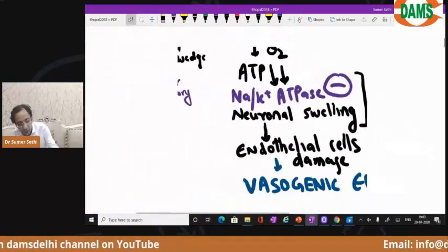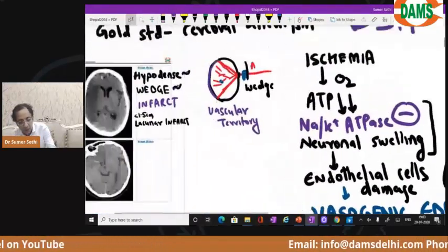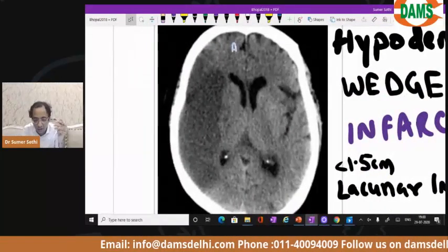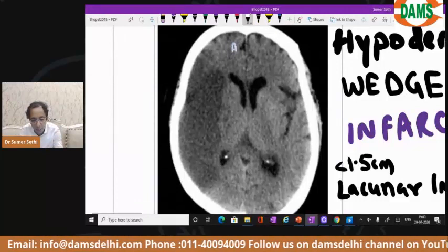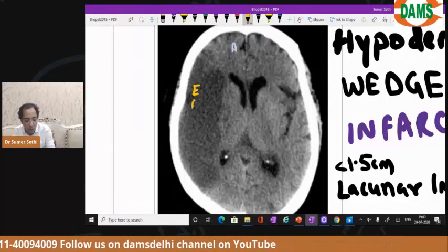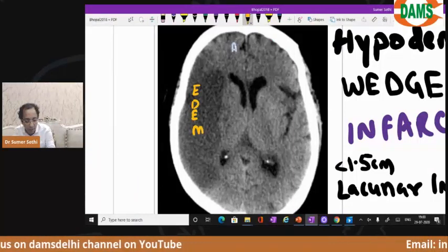Okay? Now see and answer. Now tell me, why is the brain infarct appearing hypodense? Because you have edema here.